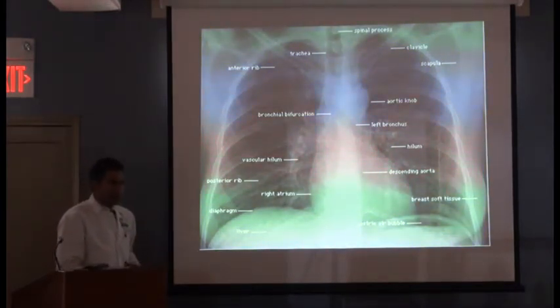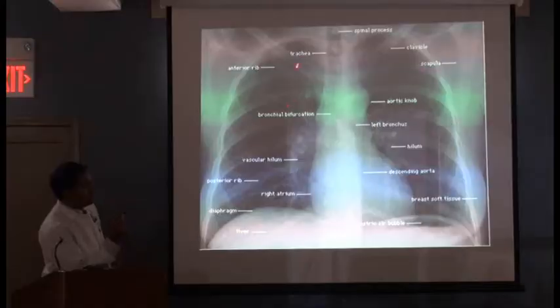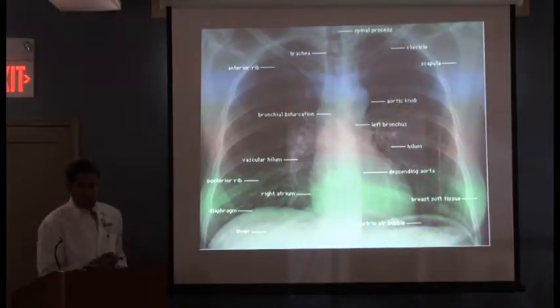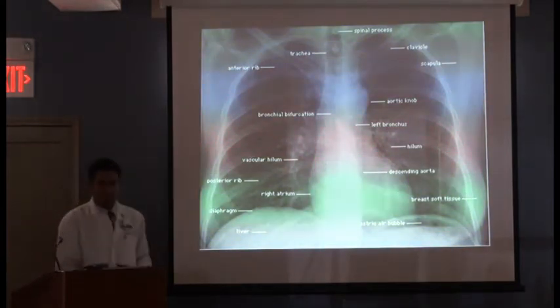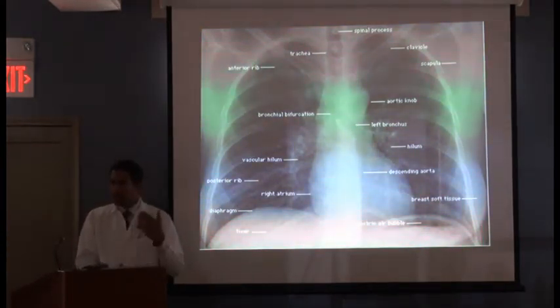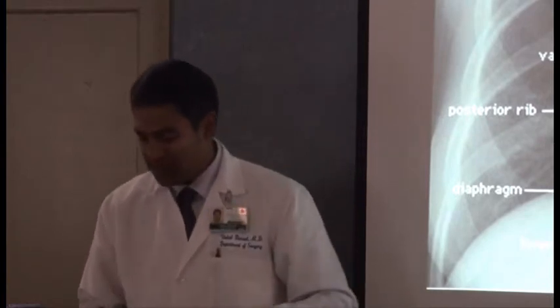Exactly, diaphragmatic rupture. That's exactly right. Those are the types of things we do. So A, B, C, D, and then E is everything else. So look, for instance, if we can see where our endotracheal tube is, look to see where our central lines are. Sometimes we look to see our feeding tubes or NG tube. All right. So that's what you should, I think, always in general try to do when there's a chest x-ray up. Go through the algorithm, ABCDs.